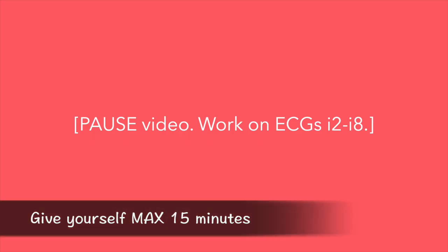Time for you to practice. Pause the video now and work on ECGs I2 to I8. Once you are ready, resume the video and I'll review the answers with you.